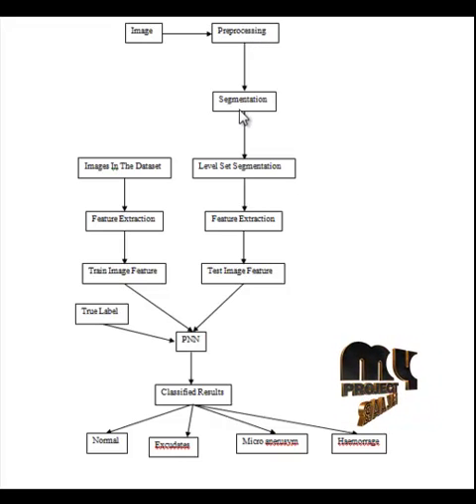Then after that we are applying the segmentation process. Before segmentation, the images were enhanced using the histogram equalization process. So the color channels of the images were separated. Then histogram equalization is applied to each channel. The histogram equalization process normalizes each color pixel of the image. As a result, the color channel values of the image were equalized so that the images have much clearer color information. Finally, the color channels were combined.